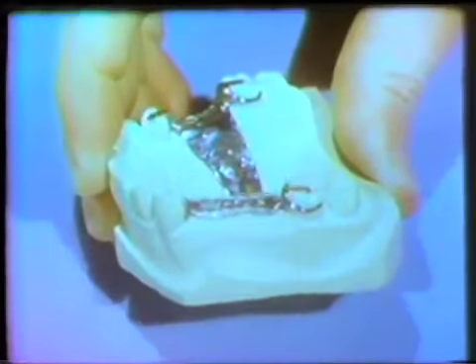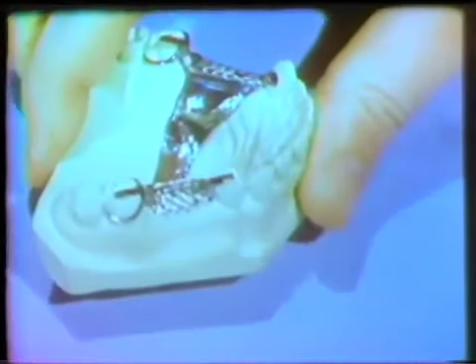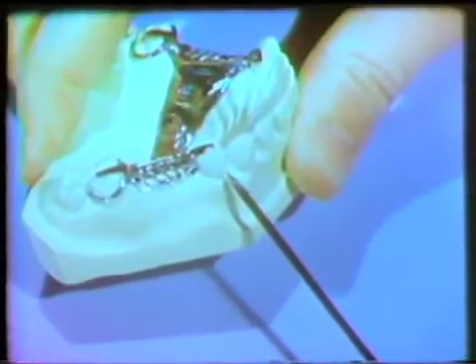This cast illustrates the rest preparations necessary for the maxillary or antero-posterior rotational path of insertion. Long positive rests have been prepared on the anterior abutments, while the posterior abutments have been prepared to receive conventional clasp assemblies. The most obvious advantage to this application of the rotational path concept is the elimination of buccal or labial clasps on the anterior abutments, resulting in an aesthetically pleasing as well as functional prosthesis. The other advantages described previously are also valid in this situation.